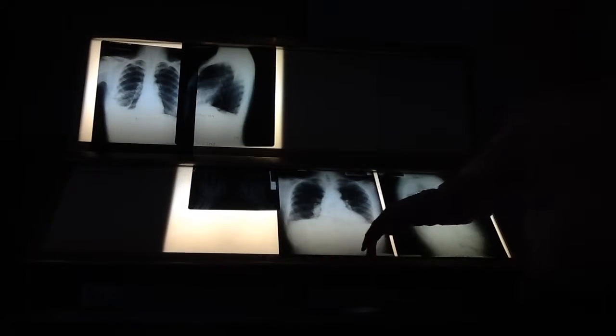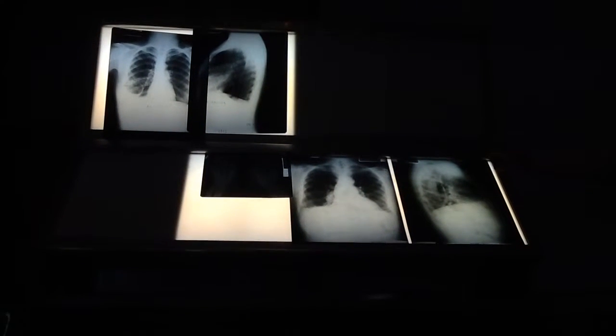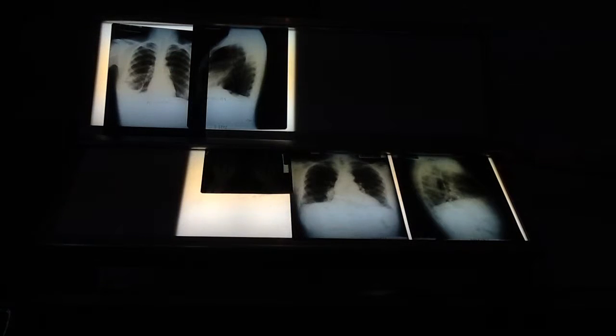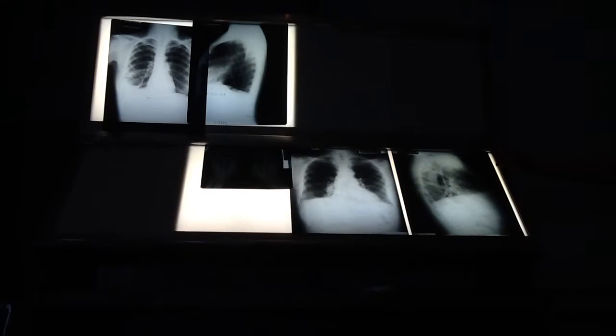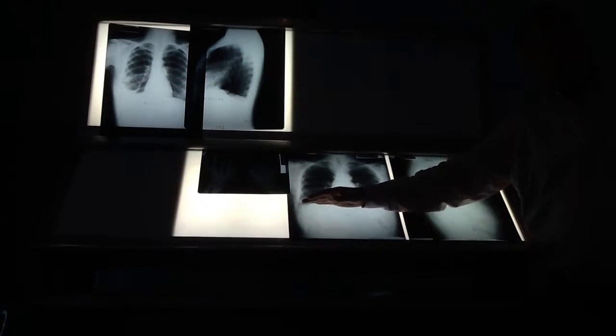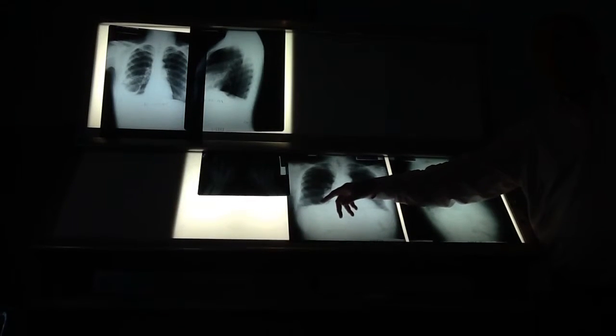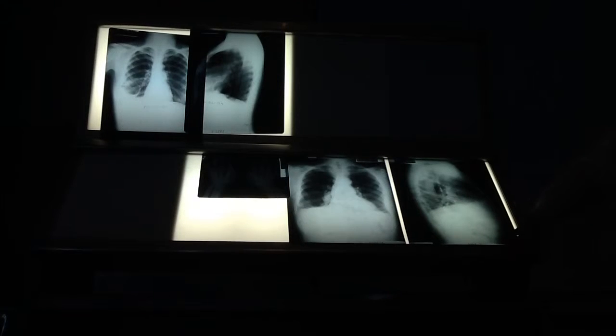If you didn't have the history, or like in this case the hand x-rays that showed you this was a rheumatoid patient, there's nothing that would distinguish the findings here from any of the other causes, okay? So in this case, we're dealing with a patient who has a lot of interstitial change, primarily at the base of the lung, and that's starting to get to that end stage where it would be appropriate to call that honeycomb, okay? So end stage of fibrotic disease, all right?